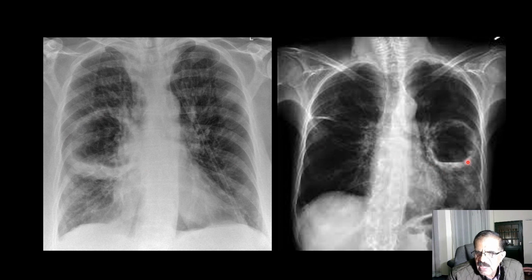In this patient, again, there is opacity. This is the right side, this is the left side, a similar, slightly smaller but completely empty. In this X-ray, again, this may be infiltration due to some infection. This again may be inflammation. So I think both these X-rays are very consistent, or at least suggestive, of the diagnosis of tuberculosis. In our country, tuberculosis is still common, so we see patients with these kinds of cavities.